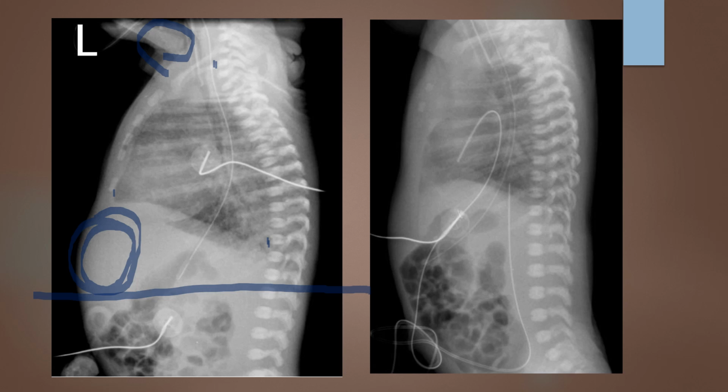However, if it was something you felt like they're really focusing on the lungs and the physician could window and level, and I don't want to expose this infant to additional radiation, you could make a case for passing this because it's a technique issue.